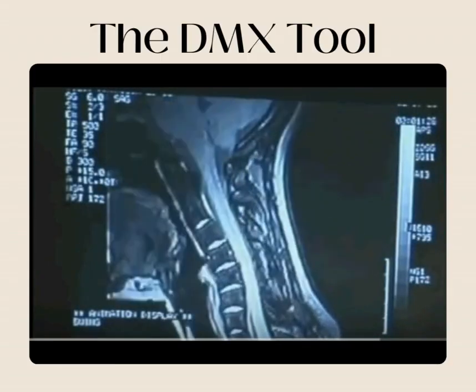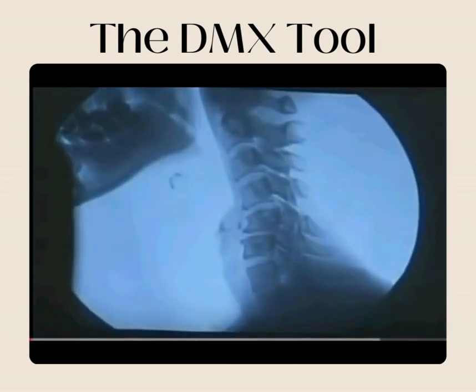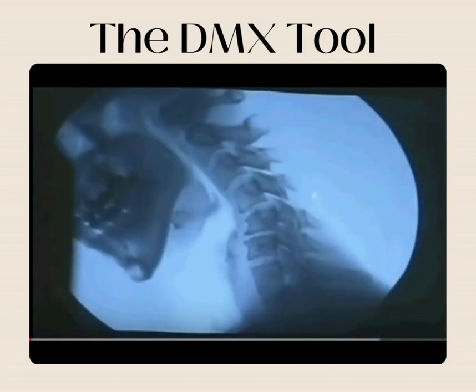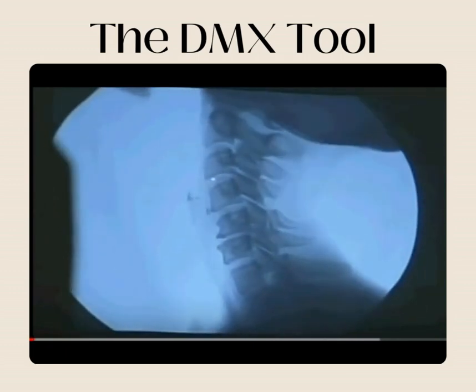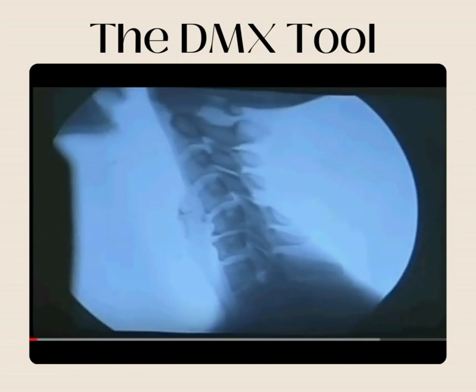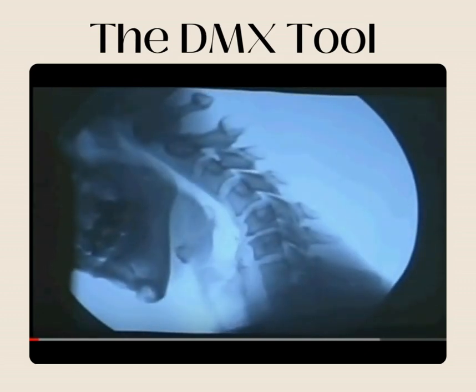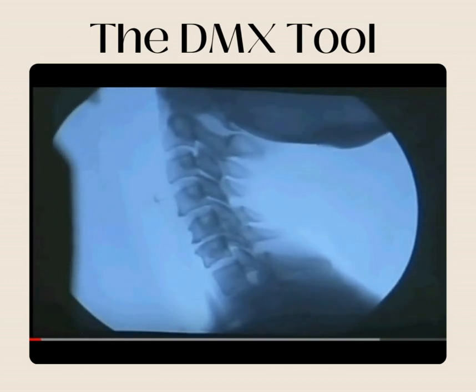Next, what we're going to see is DMX, or digital motion X-ray, which we made the bones black. We made the background white. And our bones almost look like they're outlined with black. Like I took a black magic marker and outlined my bones. Reason is our technology blackens the cortical margin of the bodies. So in other words, we highlight. You're going to see a couple things here.